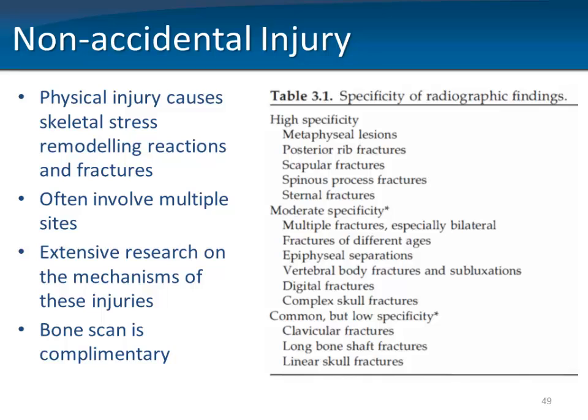So there has been identification of some lesions that are highly specific, such as metaphyseal lesions, posterior rib fractures, scapular fractures, spinous process fractures. Please note that these are fractures that are very uncommon to have in just an accidental way.